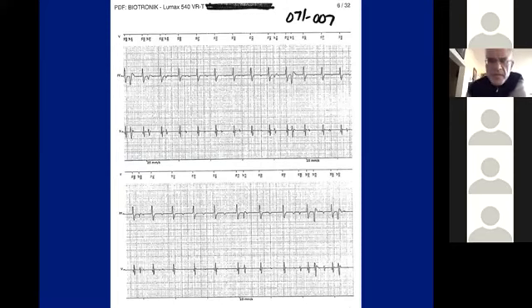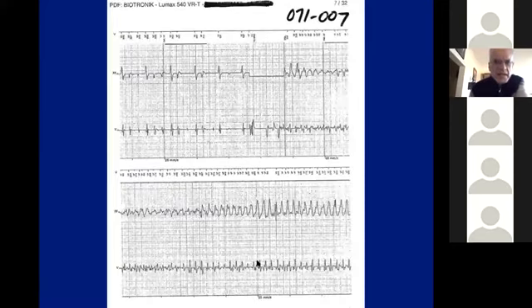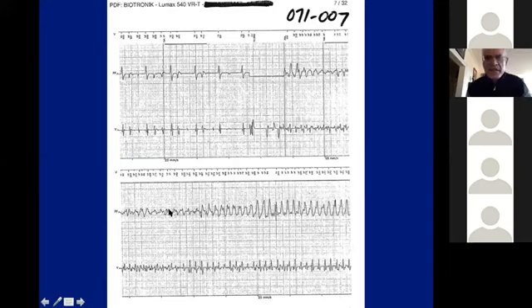Well, this is an example of noise, and let's see what happens next. Here, noise actually gets more frequent. This is QRS and this is QRS, and between them there are those signals, and the device is seeing them. Then something happens here, and then a very, very fast and different arrhythmia appears.